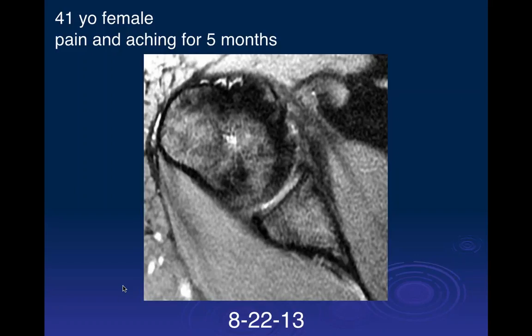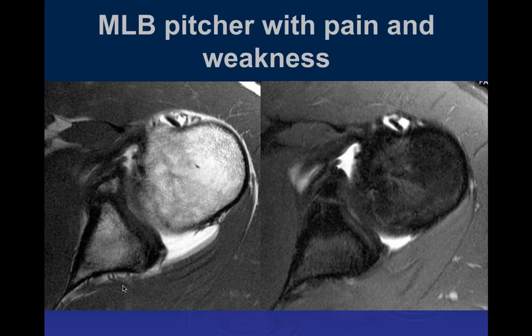That dark signal that goes across the entire glenoid, is that, John? John? Just one. Yeah, go ahead, John. Pitchers are congenital.